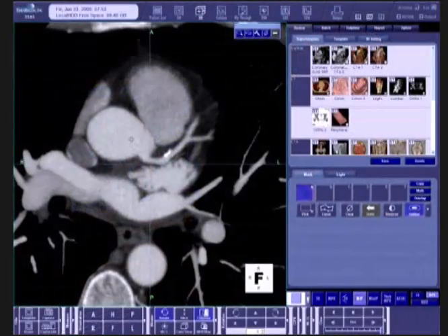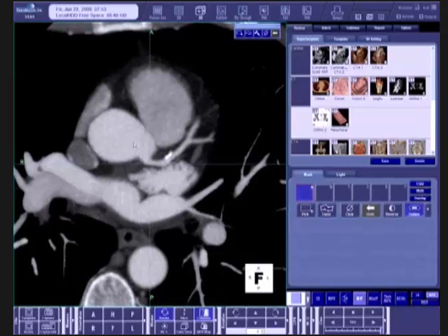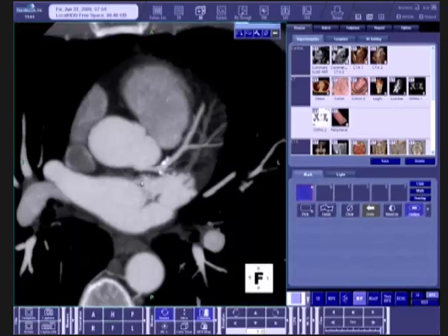So we're going to start out with the left main. What lies within focus within the navigational plane here is the left main. I will start by recording these images by capturing them, and they are displayed then on the final report. I'll do a foot view, and then I switch very conveniently to the A view, which allows me to have a general anterior view that also allows me to look at the left main coronary. Once I've captured these images, I'm now ready to proceed looking at the left anterior descending.